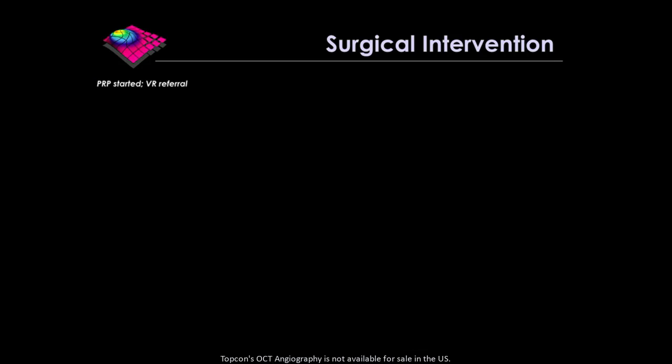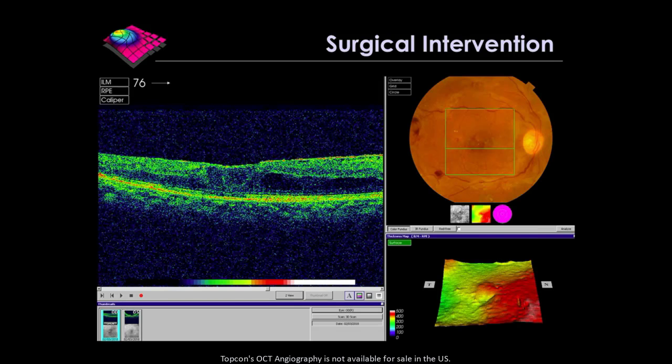So what happens? Well, in the UK we have medical retina specialists like myself and surgical retina specialists, and so I immediately refer her for surgical intervention, and she has a vitrectomy and delamination done in her right eye in September 2017. She gets an anti-VEGF one week before the surgery, which seems to be common practice now. And she comes back and she looks like this. This is the scan that they did in the vitreoretinal clinic, and anatomically she looks a lot better.